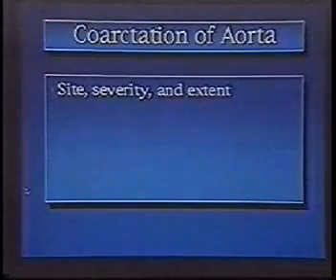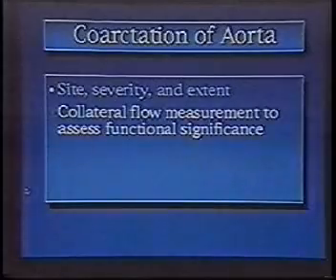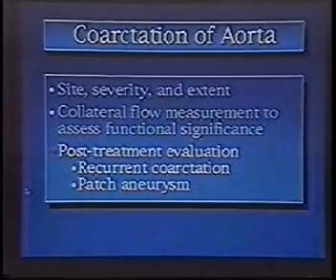So, what are we looking for in coarctation? Site, severity and extent of the lesion, collateral flow measurements to assess the functional significance of the coarctation, and post-treatment evaluation.